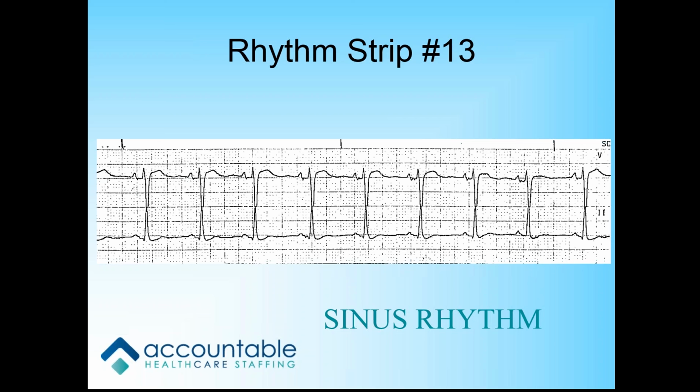So you really have to find the underlying cause. If you had a patient that came back from labor and delivery and they were in this sinus rhythm beautifully and all of a sudden you lost their pulse, what could be an underlying cause immediate post C-section that would cause this? An embolism? Or they were just in surgery, hypovolemia. Okay. So you always have to find the underlying cause on these guys. Somebody coming right out of surgery, I look at hypovolemia first, and then I start going down the list. Good job.